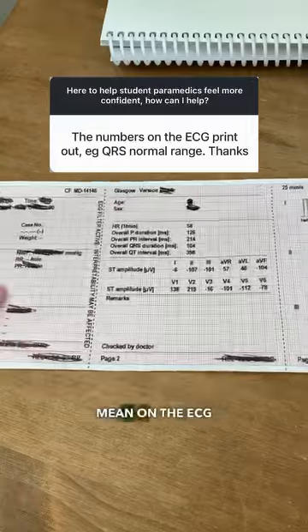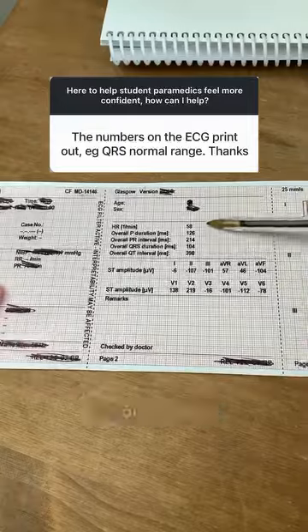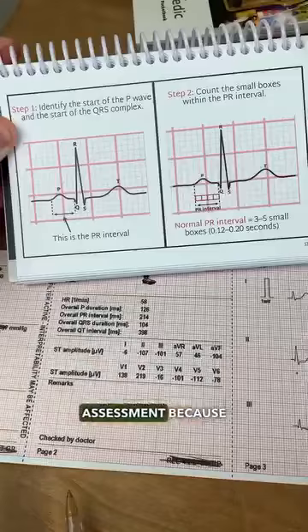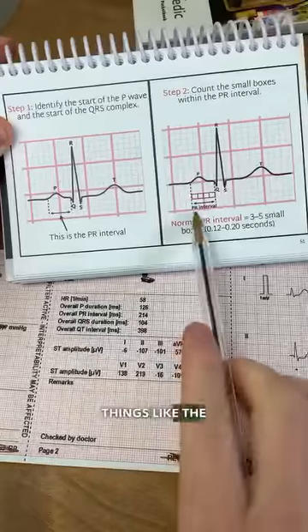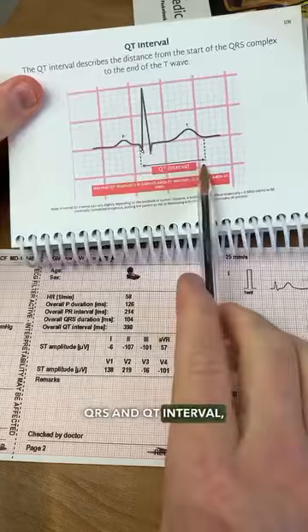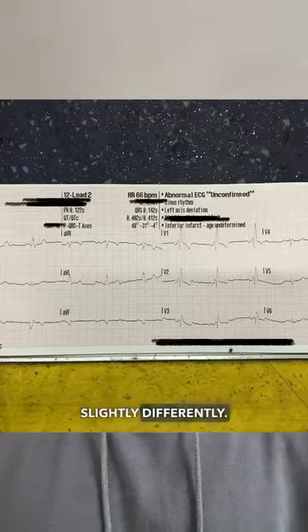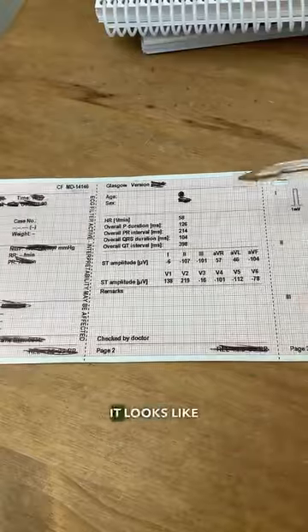What do the numbers mean on the ECG printout? So these numbers are quite useful, providing you use them alongside your actual ECG assessment, because they can help you calculate things like the PR, QRS and QT interval, as well as the heart rate. Some machines might display this information slightly differently. With the equipment I have access to, it looks like this.